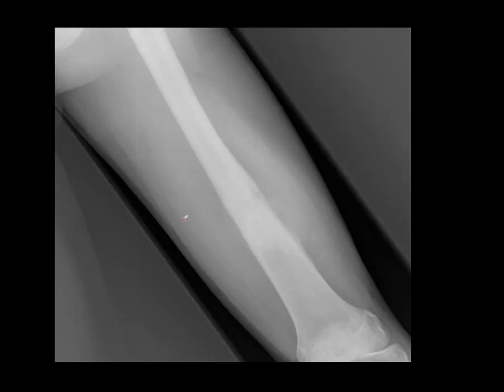Okay, so we've spoken about metastases, but I just quickly wanted to mention primary bone tumours. We don't stage that many primary bone tumours with bone scintigraphy anymore, but some places we might still perform it for osteosarcoma, for example. So here is a patient, a young man, I think he was about 15 years of age, who had an injury playing football, the severity of which was out of proportion to the injury.